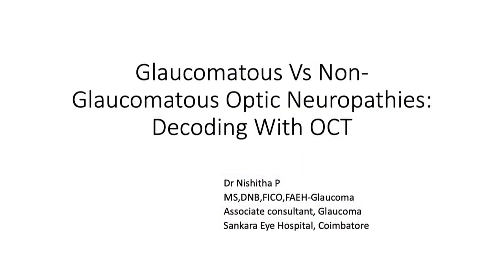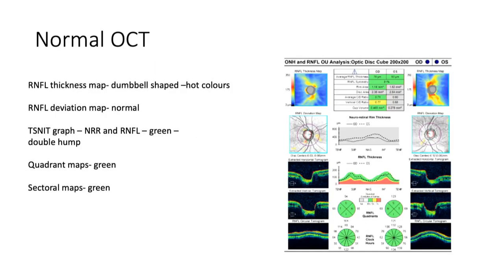Fahim. Good afternoon, everyone. So I'll be dealing with glaucomatous versus non-glaucomatous optic neuropathies, how to decode in an OCT. Dr. Faisal has already given an elaborate talk on glaucoma as well as non-glaucomatous optic neuropathies, so I'll summarize. Okay, this is a normal OCT.